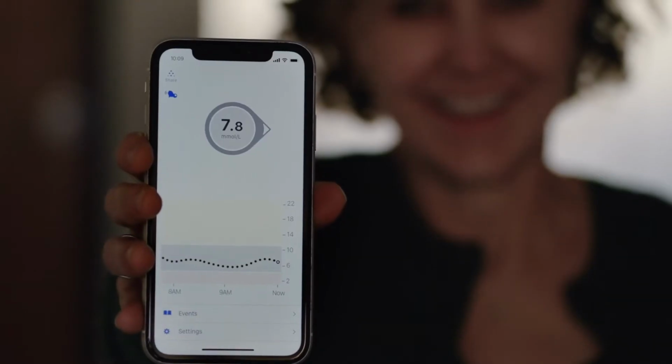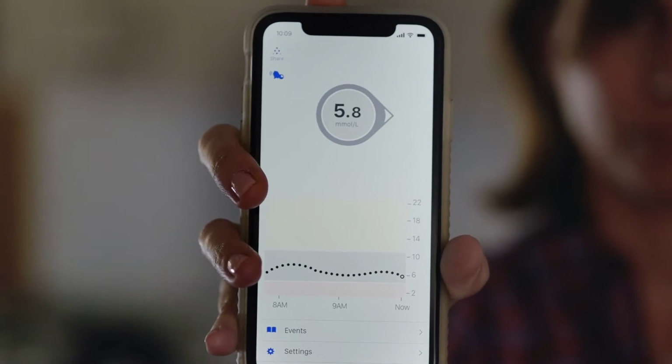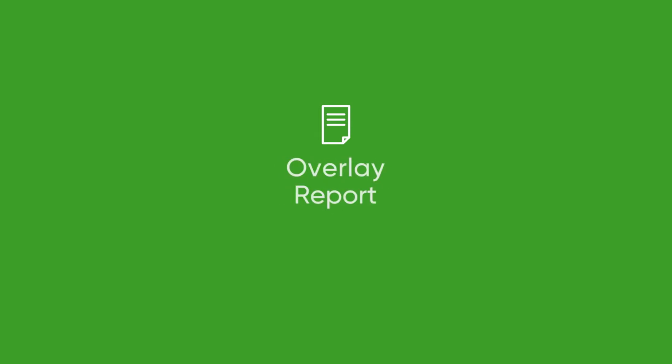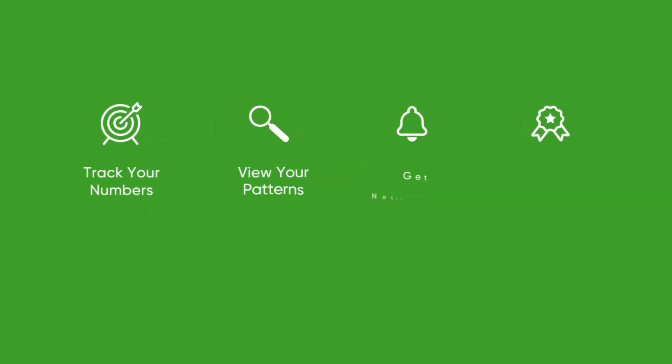Managing diabetes can be complicated. Simplify how you manage your diabetes using Dexcom CLARITY software data reporting. Quick access to a variety of reports can help you better assess and understand your health insights.